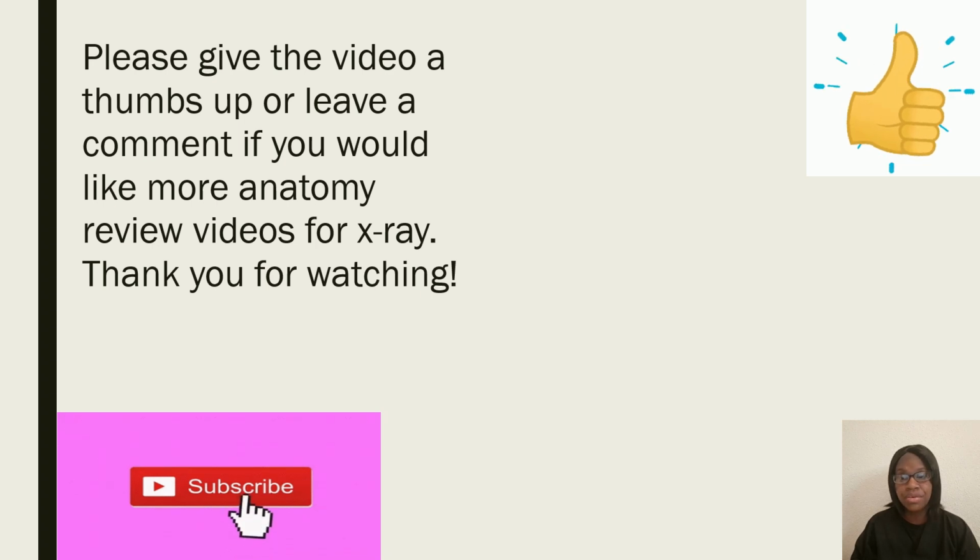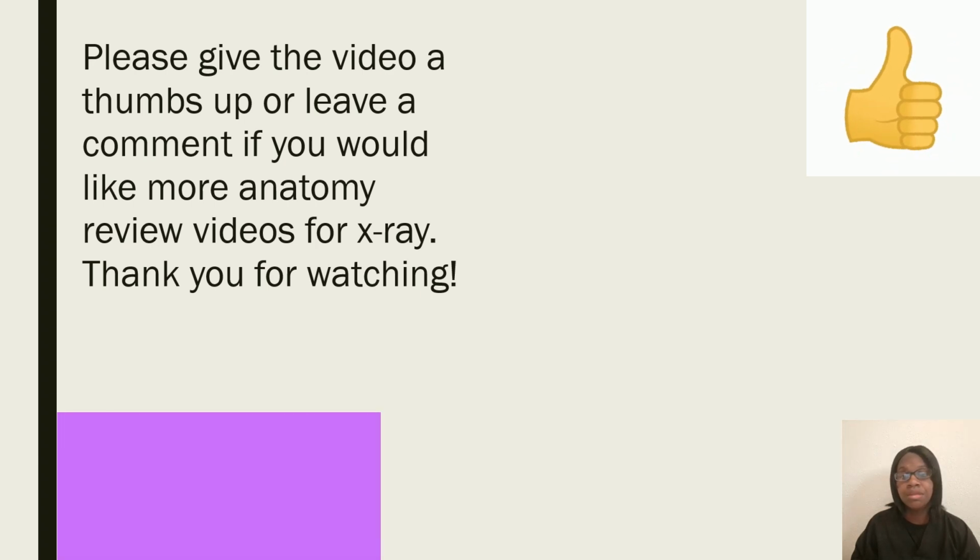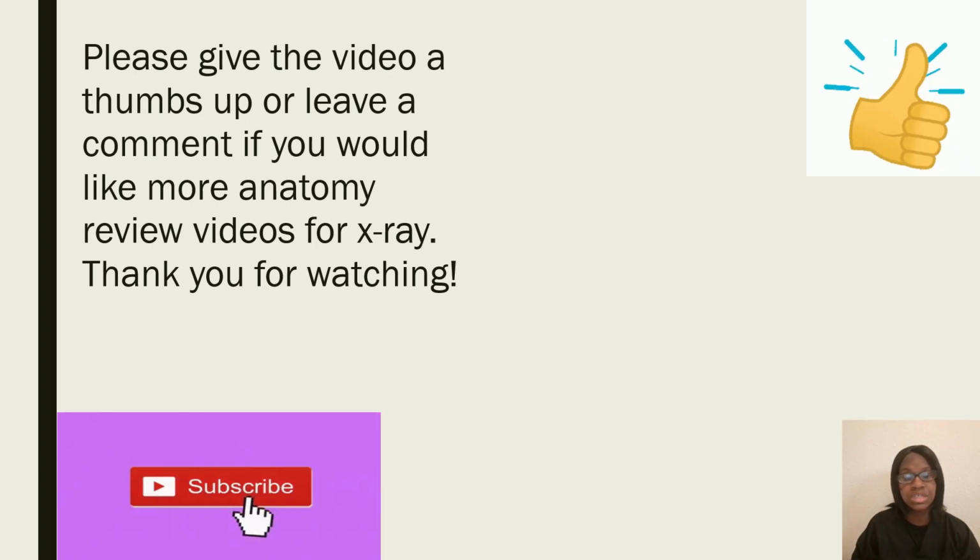I do work in radiology as a radiologic technologist, working in multiple areas in radiology, and it's very important for us to know our anatomy and those positioning standards that you've seen. That's how most of our patients are positioned, especially if they're able to walk or stand. We also do have to deviate a little bit if a patient has to sit down, so we have to angle the x-ray tube a certain way. But overall, this is just a basic introduction to what a chest x-ray is.